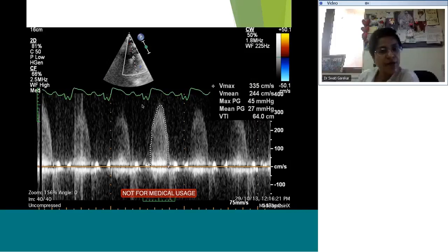I was going to take you through the take-home message at the end of the entire presentation, but I'll share my thoughts on this even today. First, take your time when you are dealing with valve pathology and complete your entire echo, and only then come to any conclusion. Like I said, don't just stop at supramitral membrane. Look at things more distally also. Look for the entire Shone's complex, for example.